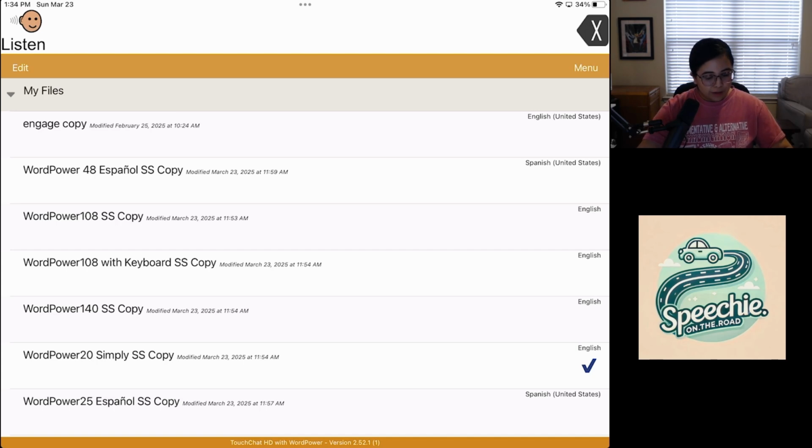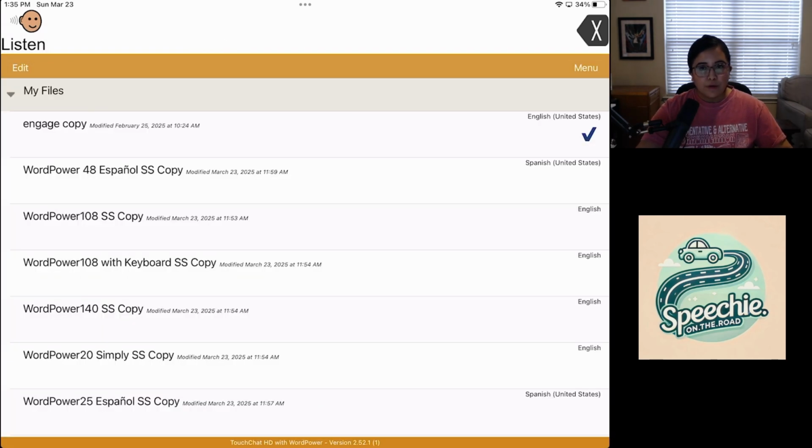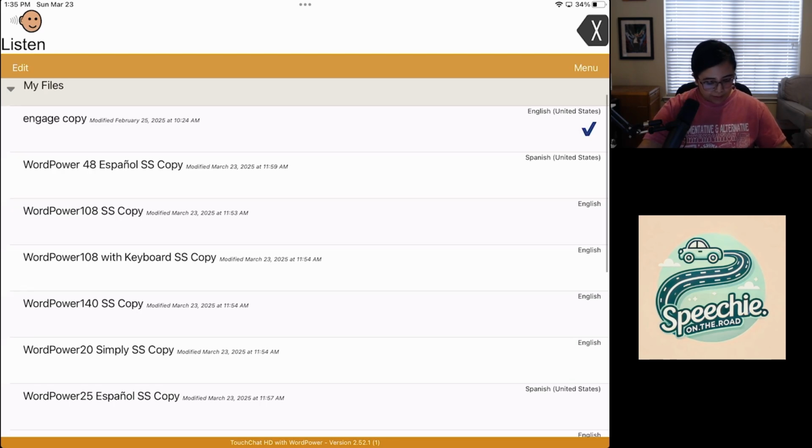Recently, they also added an Engage page set, which has more like access games, and you can practice smaller button grid sizes if someone just needed that quick intro in how to interact with the AAC app. Okay, so let's go back to Wordpower Basic 60.